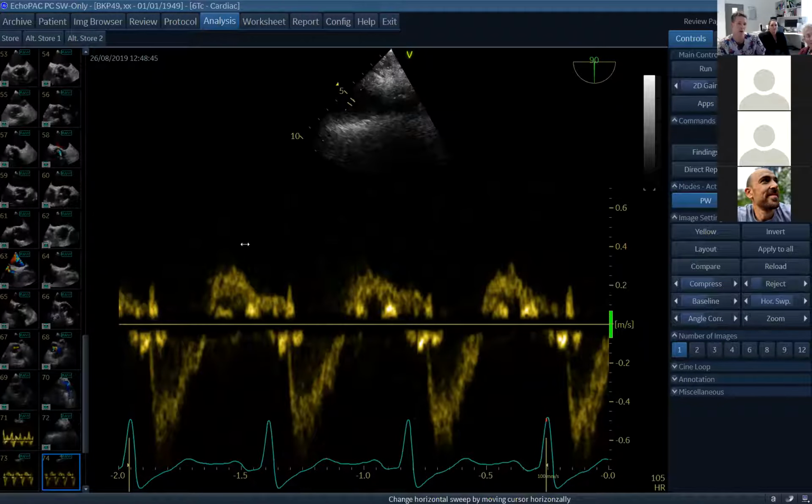Very nice. And then the holodiastolic flow reversal is not normal here. They classically talk about it being 0.2 meters per second associated with severe AR when you're in the descending aorta. And again, the angle's not perfect, so I think we are meeting that criteria. And again, tick, tick, tick, severe AR. And then the last thing you've got to remember is you're in a DDU exam, which is for clinicians. So whatever the story is, what would you say to the examiner after you've given them that spiel?